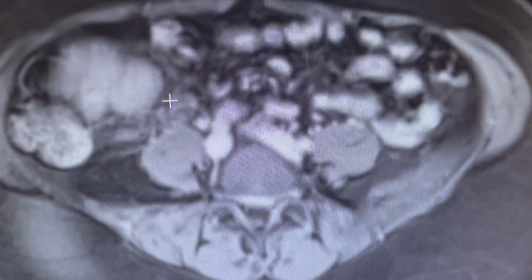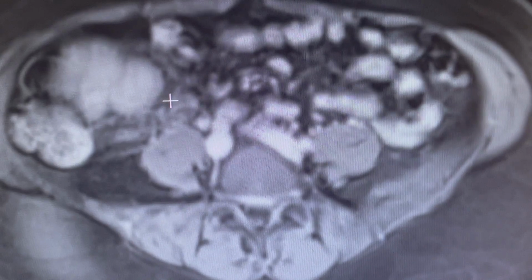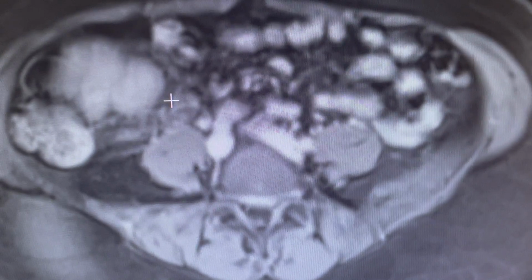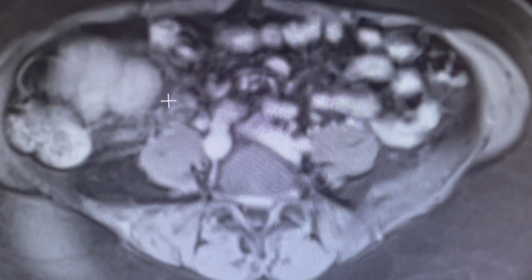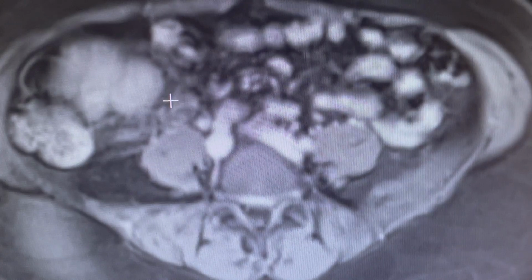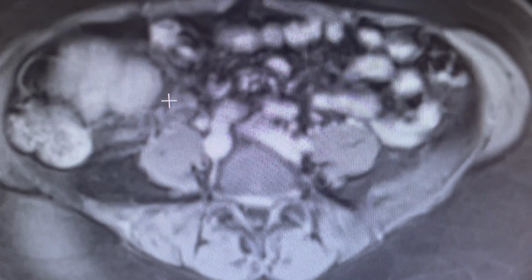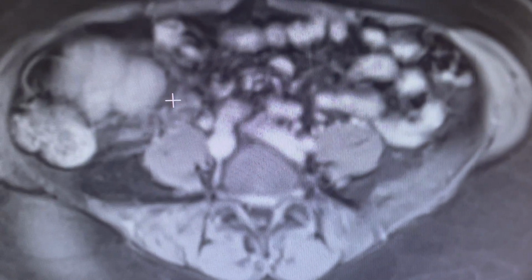But the high signal intensity of the larger lesions rules out FNHs and HCCs. Now, HCCs, when they're the size that we saw the bigger ones, always show washout. So we cross out HCC as a possible cause.